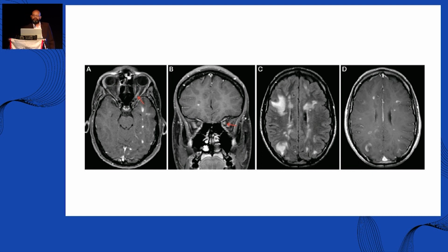What do you think these are? Yes? Simple? Yeah? What do you think these are? Optic neuritis? Neurologists? Yes? Is optic neuritis due to multiple sclerosis? You can see the periventricular and juxtacortical lesions, which are very typical for multiple sclerosis.